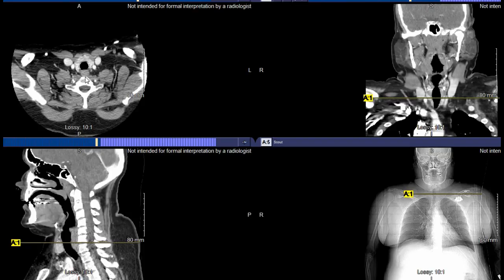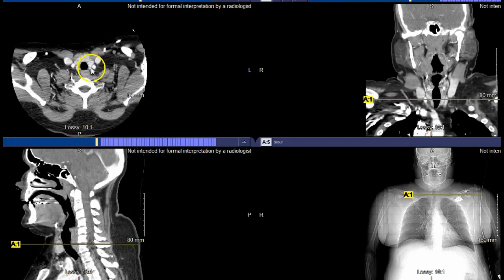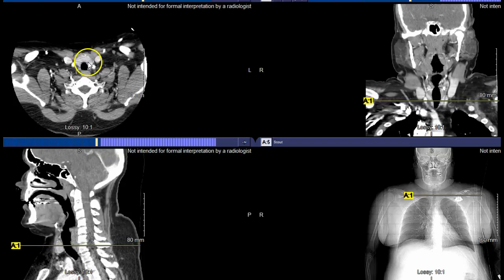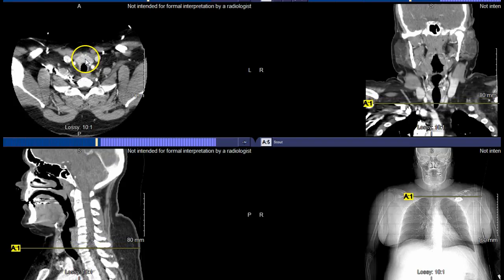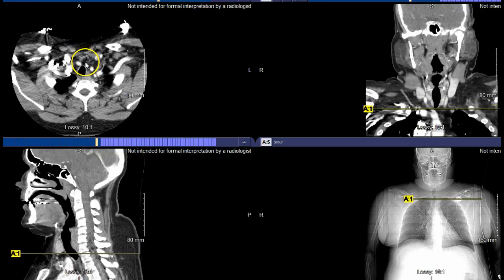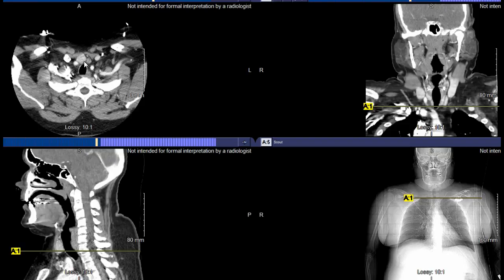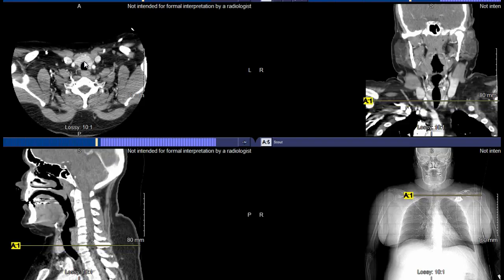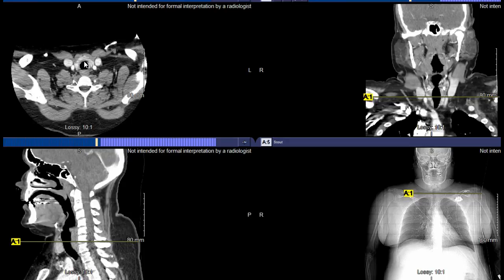One of those structures that I want you to know is definitely the thyroid gland. You can see that structure here, wrapped around the trachea, and it does have what I consider a glandular-like appearance, like tapioca or cottage cheese. You can start to see that there, and you can see it's gone. So it's not on a ton of slices, but nonetheless you can effectively visualize it as we go through.